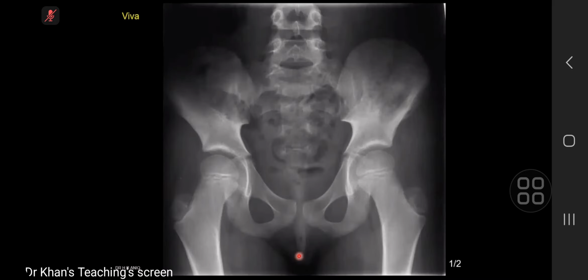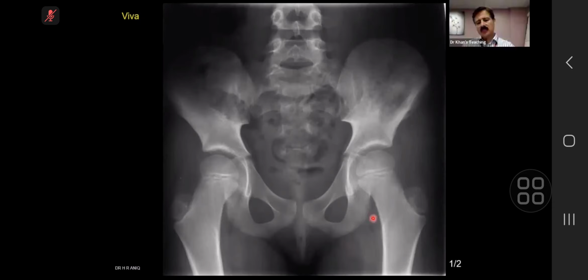There's also possibly some lucency within the iliac, in the medullary cavity within the ilium. The appearances overall are aggressive, and again, I'll be concerned about an aggressive process such as Ewing's, osteosarcoma, or infection, and would recommend an MRI. Okay, very good. If you see this case, very subtle findings, and you are expecting this kind of an observational film in the exam.